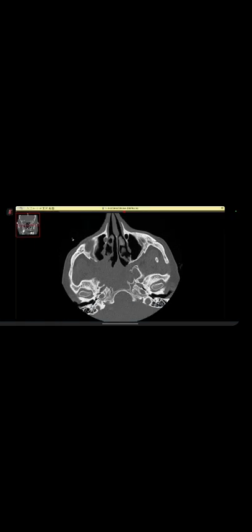Let's go to your case now. In this case, this was a CT.